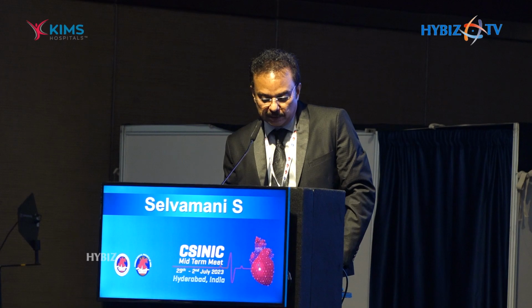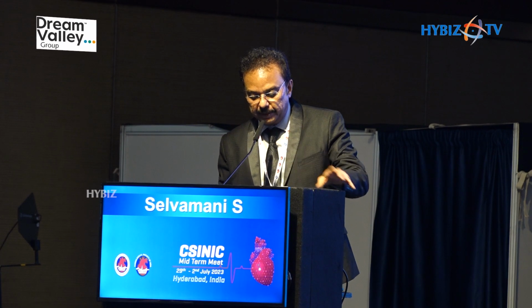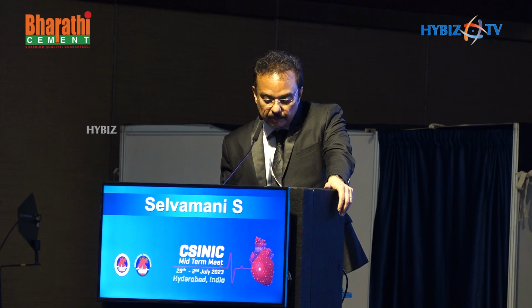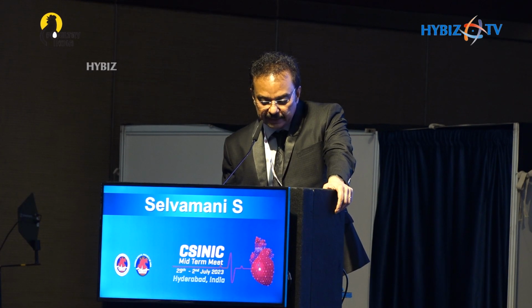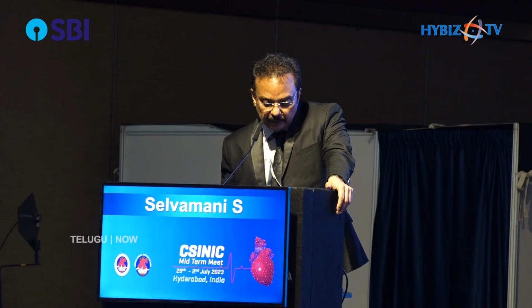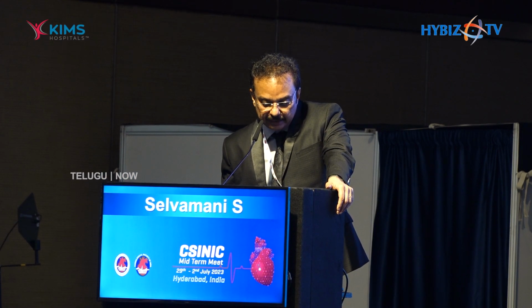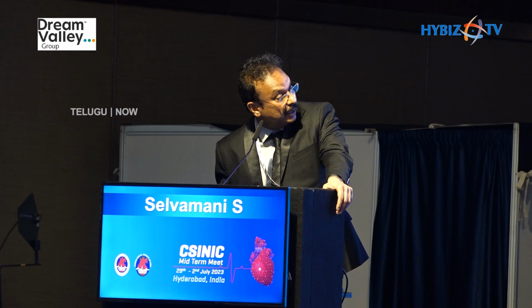Basically, most of us, when you look at the angiogram, feel there is probably a ruptured plaque or a thrombus there, or something is happening. He had a stent in the RCA also, which had a problem, which had occluded. Look at the OCT here: what it clearly shows is a stent, and after that there are ectatic segments, very clearly seen.